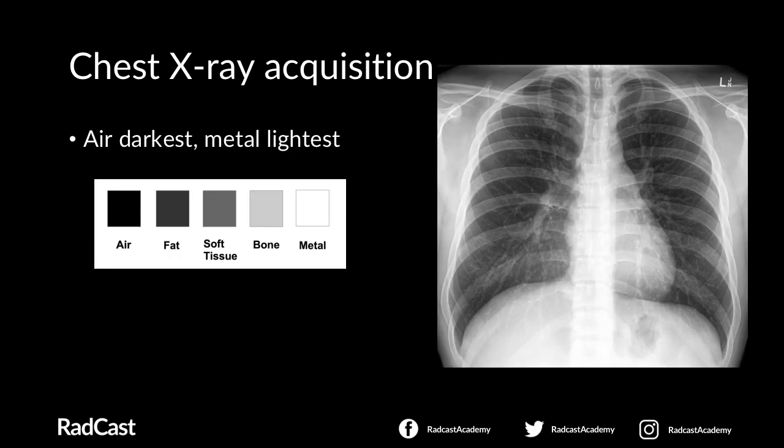Now, all this comes together when we look at our first chest x-ray in the talk, as you can see on the right in this slide. So this is an erect chest x-ray taken with the patient holding a breath in inspiration. Notice how the area of the lungs in general appears black, as they contain all of that low density air on inspiration. It allows all those remnant beams to reach the detector to travel through that low density tissue, or low density air even.